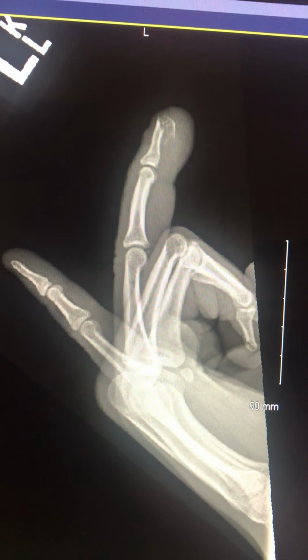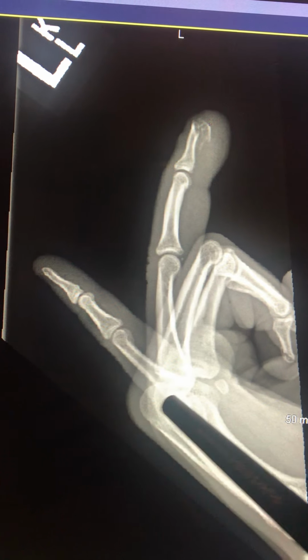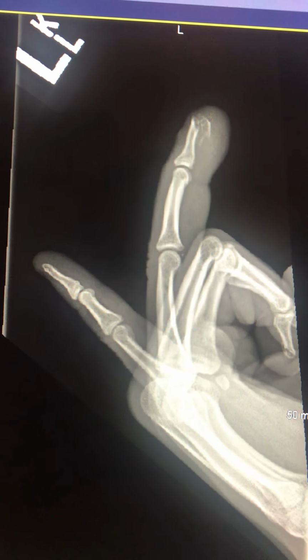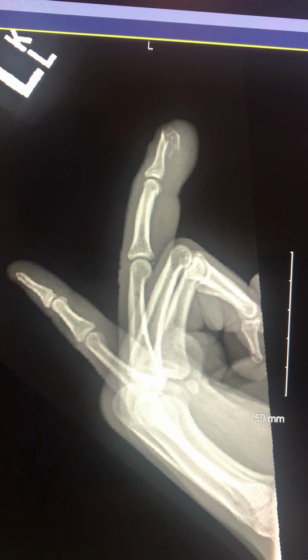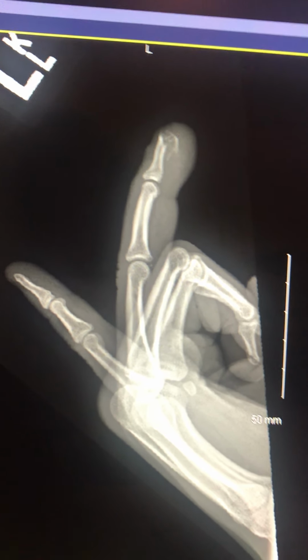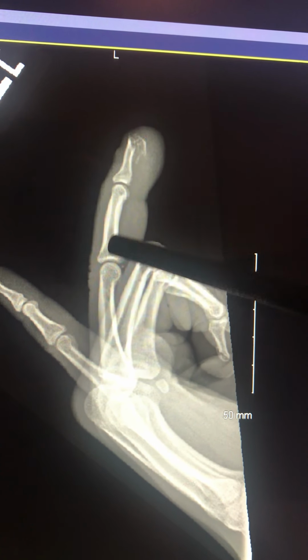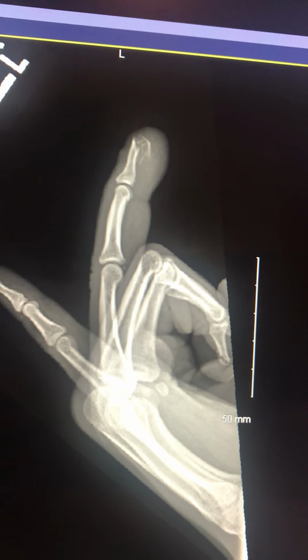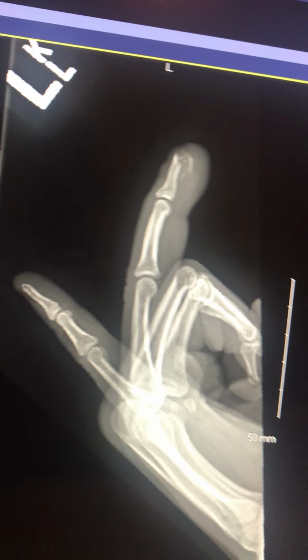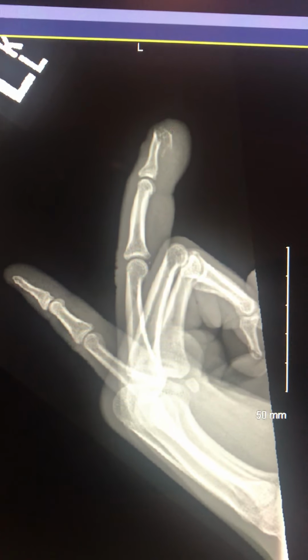He was in pain, so he couldn't pull these fingers farther to get the MCP better seen. The joint spaces are open though, very open, which is good. Good lateral. There's trabecular marking and soft tissue is seen, and the patient was shielded.